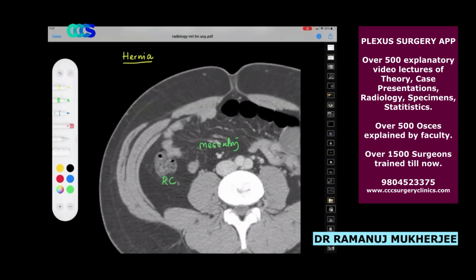Point number 2. Now see the muscles. The third muscle down here, for which I should use 3 colors, is the transversus abdominis. The second muscle, which appears much bulkier, is the internal oblique. You can see how bulky that muscle is. The last of the muscles is the external oblique.